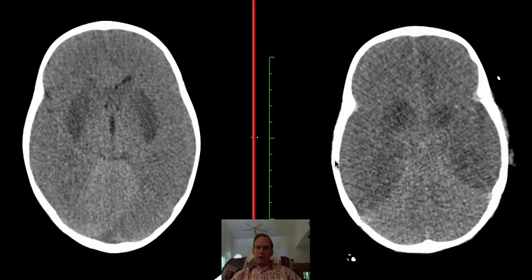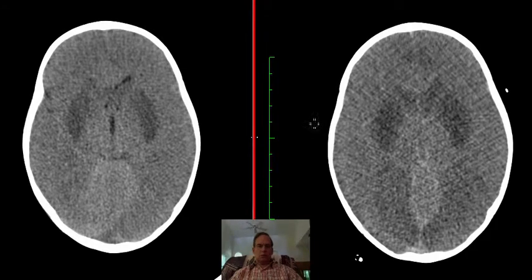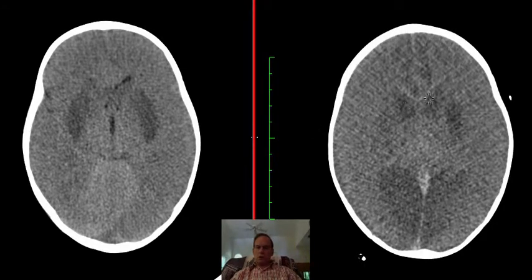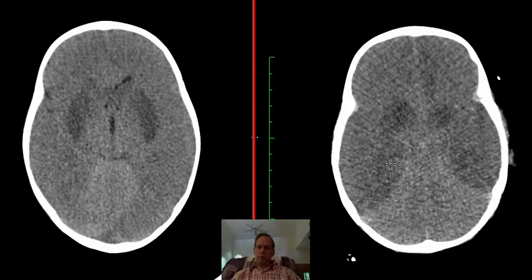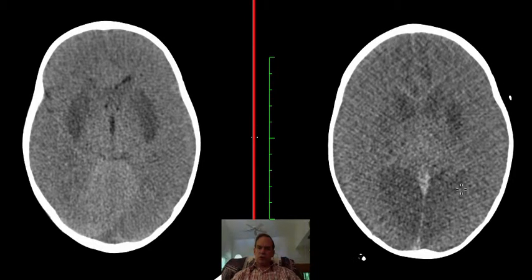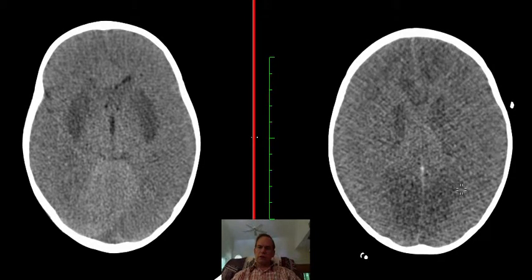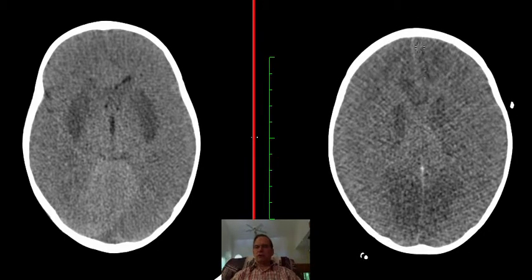And now we can see areas of abnormality not only in the caudate nucleus and the putamen and globus pallidus, but more clearly in a broad swath of the occipital lobes, which is posterior cerebral artery distribution here, the medial aspect of the occipital lobes particularly, and I think we can see portions of the anterior cerebral artery territory more clearly than on the other case.